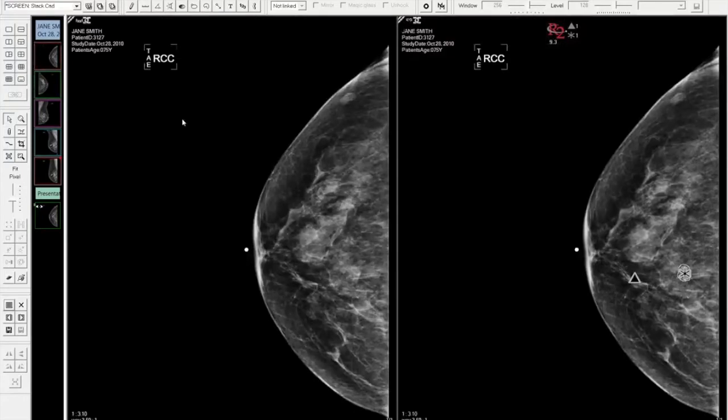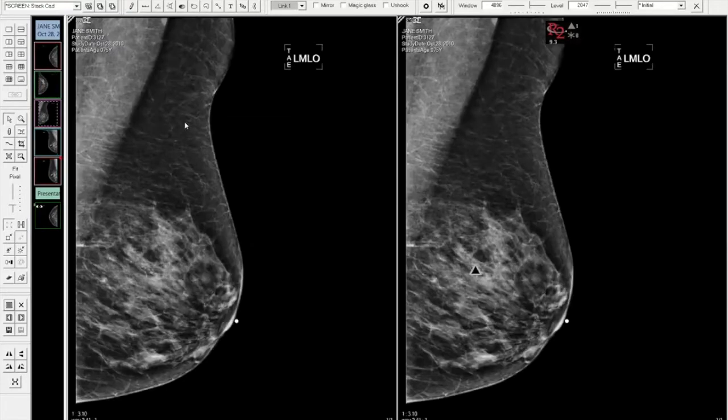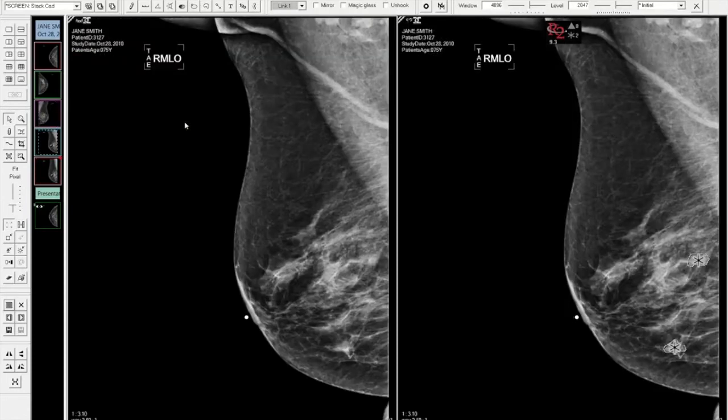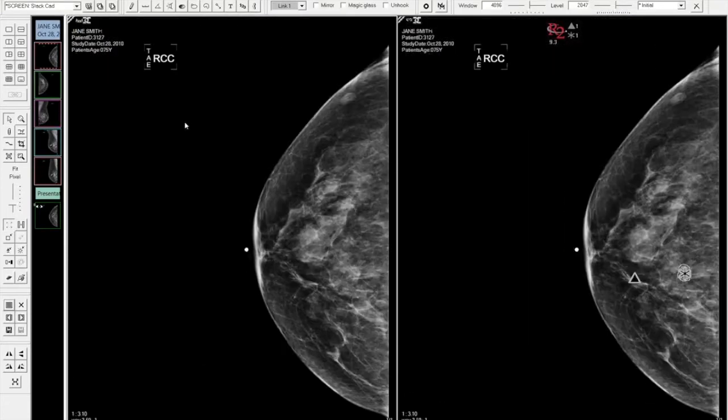Click the button. Now I simply, arbitrarily, just chose display formats, saved them as individual hanging protocols, and put them in sequence. So now I stacked my presentation state images next to my clear images so I can see them side by side. Again, totally arbitrary. Whatever the radiologist chooses can be their hanging protocol.